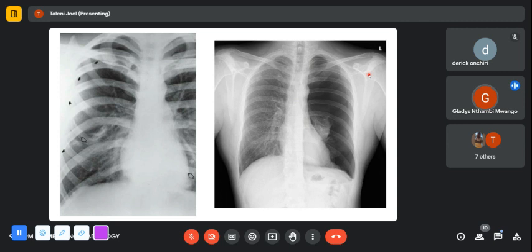All right, thank you, Sharon. I wanted to put these images side by side so we remember to always inspect the lung margins closely, because you can miss the pneumothorax. But this one you can't miss.